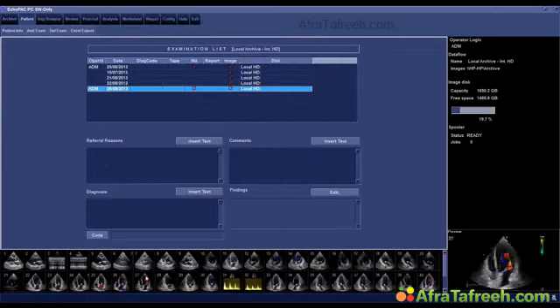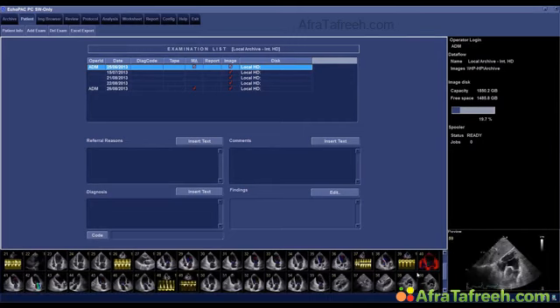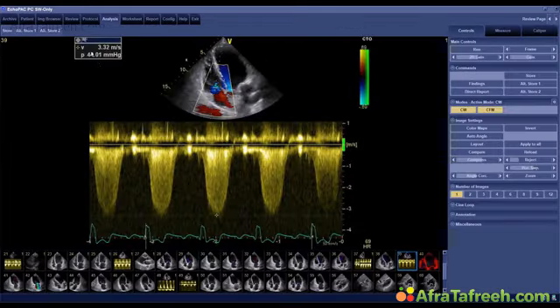Okay, here we go. But going back to the patient, the other issue which is important is the fact that he does have pulmonary hypertension, but it is not so severe. The gradient here is 44 millimeters mercury. Maybe if we add 5 or 10, we'll get to 54. So there is pulmonary hypertension. I would say moderate, but not severe.